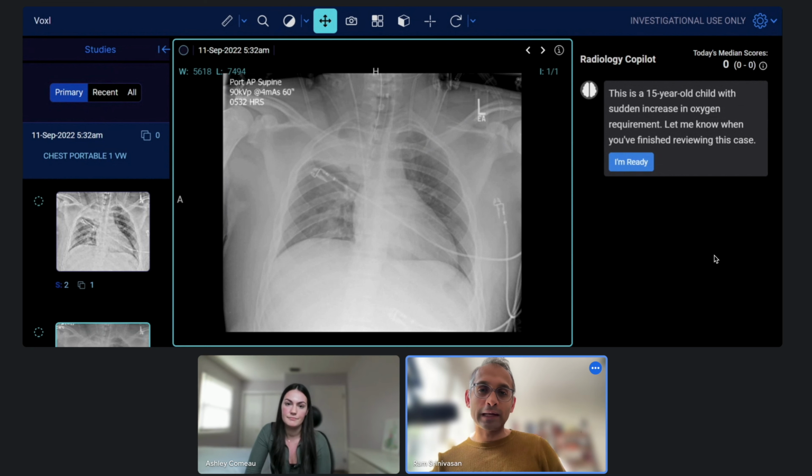The field of view, is it adequate or inadequate? I'd say it's adequate. You can see the base of the neck and then the upper abdomen, and you just want to make sure you can see both of the costophrenic angles. So I'd say it's good. Awesome. What acronym do you use to assess pathology? So you use the ABCDE acronym. A is for air, B for bones, C for cardiomediastinum, D for diaphragm, and then E is for everything else.